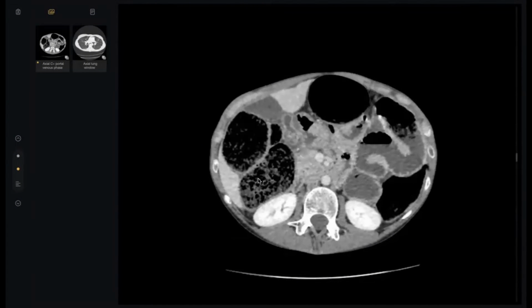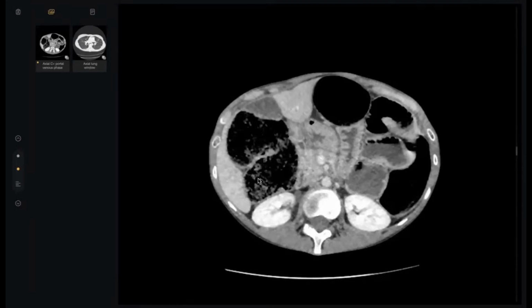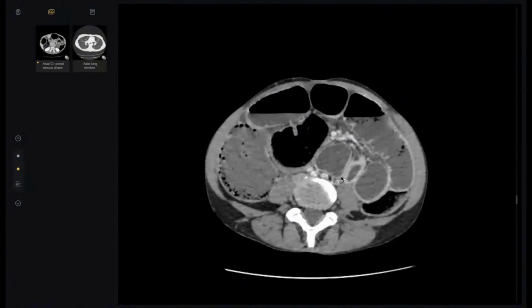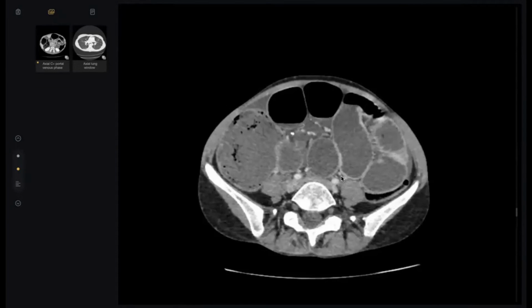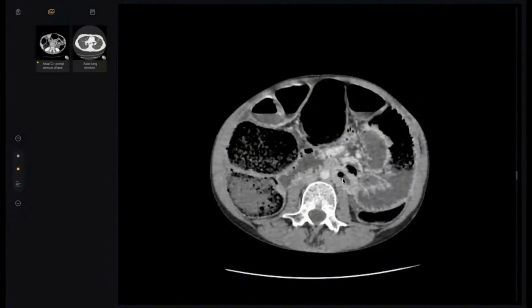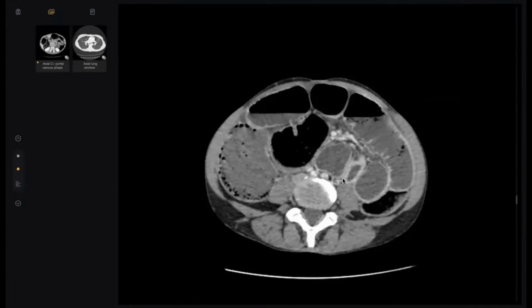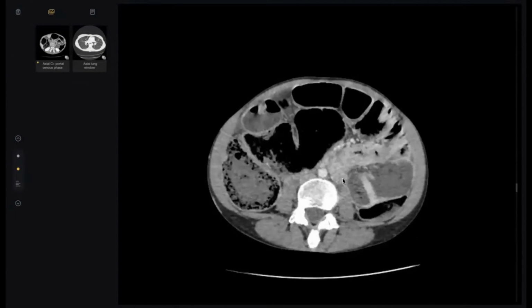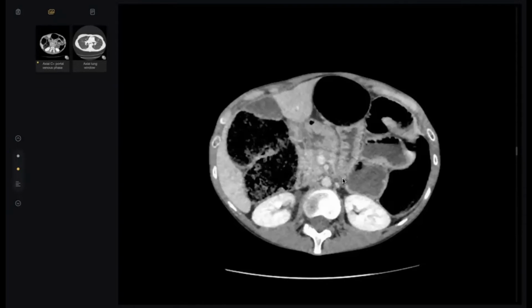So, what's your differential or final diagnosis? Keeping in view the findings of the abdomen of dilated fluid-filled intestines and also some wall thickening with enhancing mucosa, I'm thinking on the lines of scleroderma and systemic sclerosis, given the hidebound appearance. I will convey the findings to the referring clinician as this patient needs urgent decompression because of the dilated bowel loops.